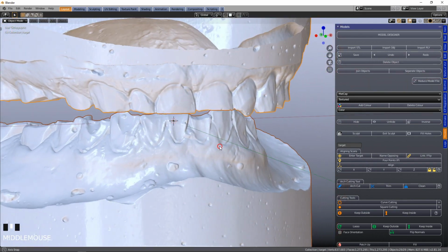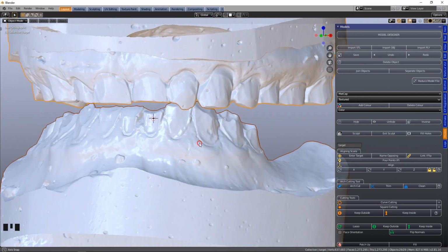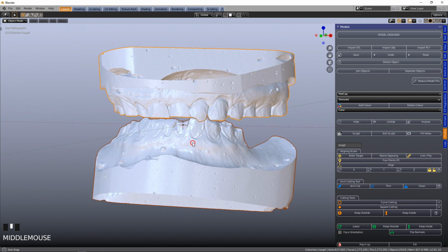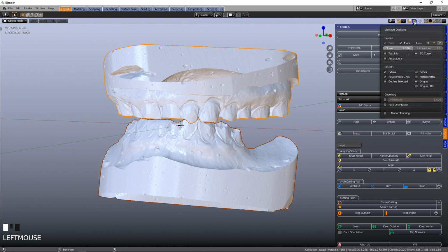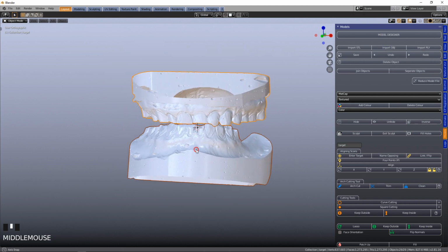They're semi-prepped, I think, or I'm not 100% sure. Yeah, it looks like preps. Next thing we're going to do is work on these models. Now we don't need the floor anymore, so we can hide this if you want to get rid of it. So X, Y, floor and grid hidden away.